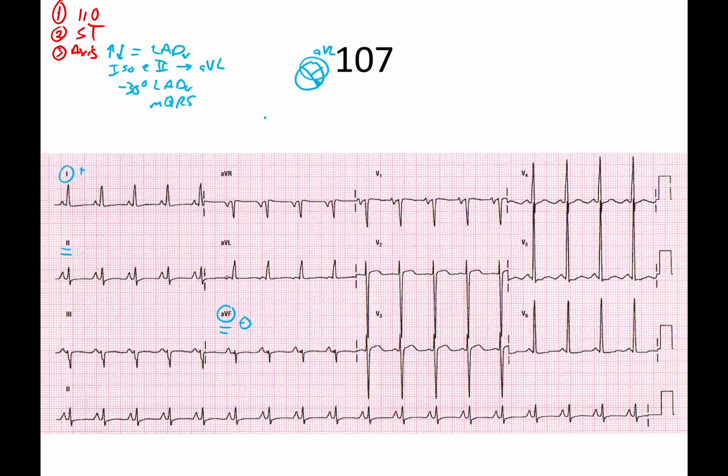I'm going to shift things over a little bit, and we're going to do number 4 over here, and we're going to say WPW. Do we have any delta waves? And we look them through. One could maybe try to make an attempt for arguing that one, but it's really not because you don't see the sloping anywhere else. So we're going to go ahead and say no on that. Step number 5.